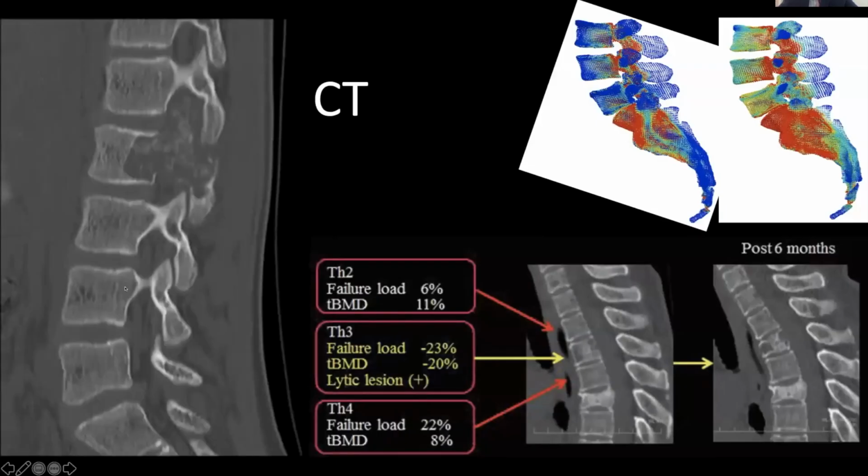So again, CT depicts cortical bone very well. You have some assessment, as you can see here, of the trabecular architecture of the bone. For example, here you can see there's this infiltrative lesion. And just for orientation, you guys probably know you have your vertebral bodies, you have your pedicles, you have your posterior elements, including your lamina and the pars articularis going down here, depending on the orientation of the CT.